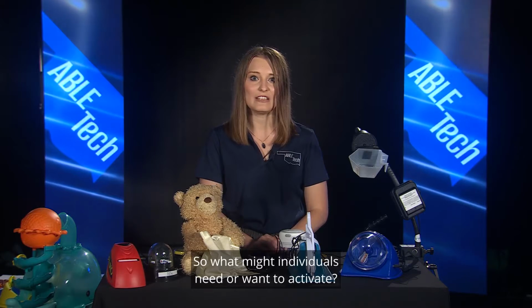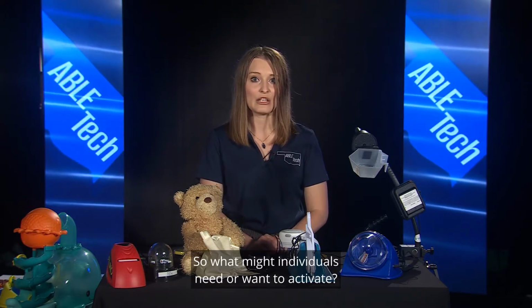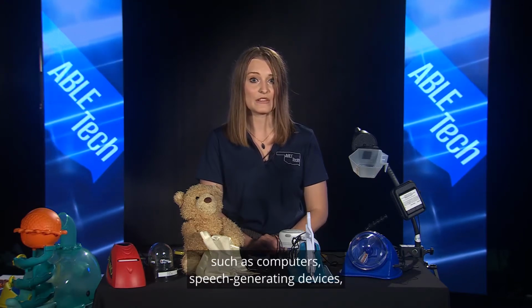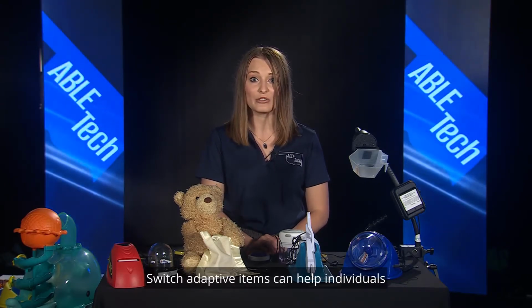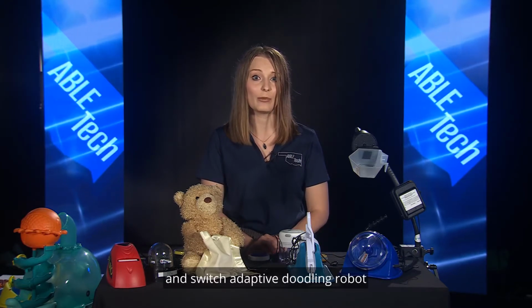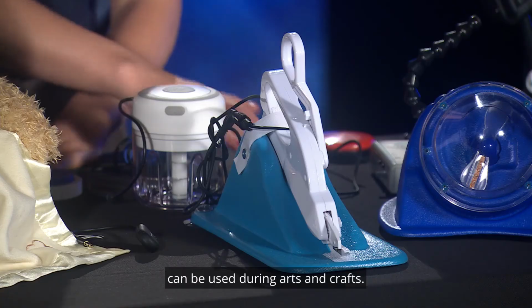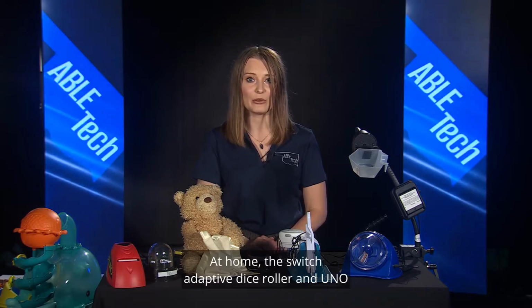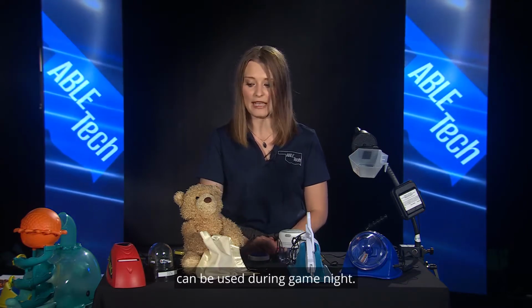So what might individuals need or want to activate? Switches can connect to many types of devices, such as computers, speech-generating devices, home appliances, and toys. Switch adaptive items can help individuals become more engaged and independent in all environments. In the classroom, the switch adapted scissors and switch adaptive doodling robot can be used during arts and crafts. At home, the switch adaptive dice roller and Uno can be used during game night.